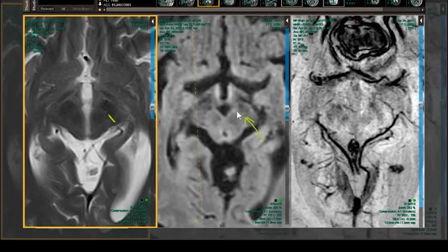Well, this is a neurodegenerative condition, so as these cells die off, those two bleed together, and you're just going to see a big glob of hypointensity. Those are your earlier signs. When somebody has flat out Parkinson's way down the line, that's going to be pretty obvious, but you have to get a sense of what it looks like earlier on when they're trying to establish a diagnosis.